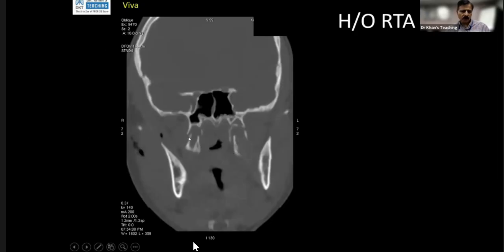Can you describe this? Yeah, there are multiple fractures involving the bilateral, medial, and lateral pterygoid plates, as there is also a mildly displaced and linear non-displaced fracture of the right frontal bone. So this is likely one of the subtypes of Le Fort fracture. So I would like to, in my routine practice, review the rest of the images to further characterize the type. Excellent, well done.